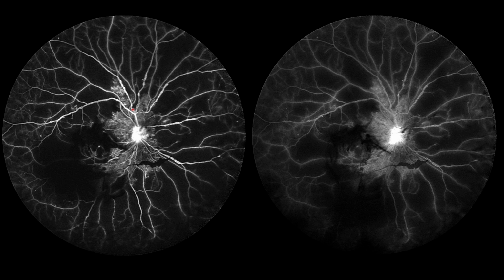So here we know, looking at the disc, it is becoming hyperfluorescent and remaining so. If I ask you to draw the disc, you can't, because this margin is totally fuzzy. So again, intense hyperfluorescence which is spreading. So we know there is a new vessel at the disc itself. And in these areas, these are not new blood vessels, because again, if you look at these beading areas, you can see with time the hyperfluorescence is going out. So there is no leak here. Just the normal blood vessel has got distorted because of the global ischemia.